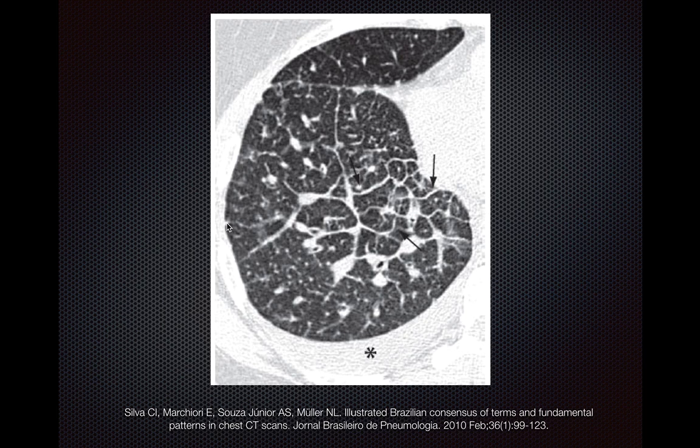And again, I think you can kind of appreciate why you might see that. If you have linear localized interlobular septal thickening here, if you place a transducer here, you can see why sound waves might be trapped and get reflected. And again, the important thing here is that lung ultrasound is really imaging the very periphery of the lung. So we won't be able to make any comment in the central aspect of the lungs, but as long as you have findings that extend out to the periphery, such as here, here, and here, lung ultrasound is quite equipped to detect those changes.